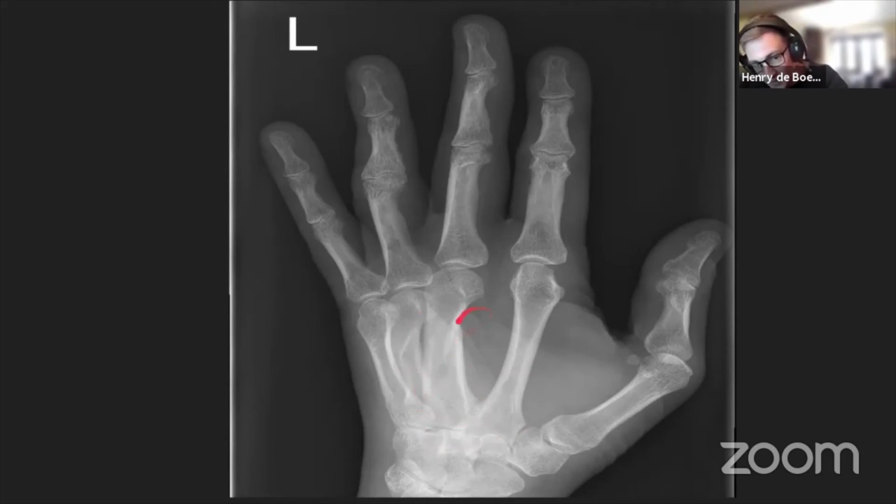But what catches my eye is on this oblique view, the metacarpal alignment is not right. These are all bunched up, and then there's a big gap, and then there's this index finger. Although it's not a dedicated wrist film, there's space between the carpal and metacarpal joints, space here, but at the base of the index finger there is no space and it's overlapping the carpal bones. That's not normal. So I am confident that there's going to be a dislocation here.